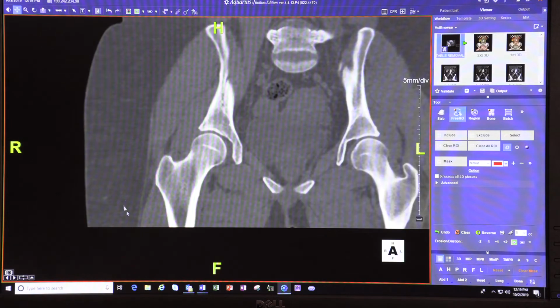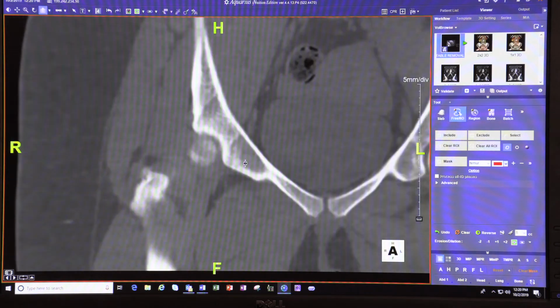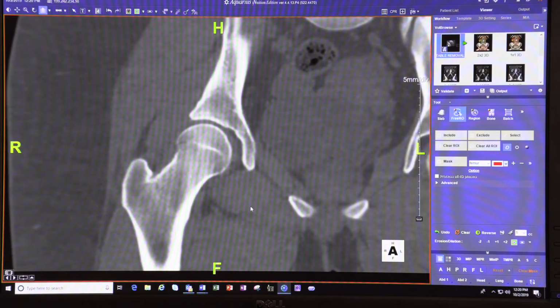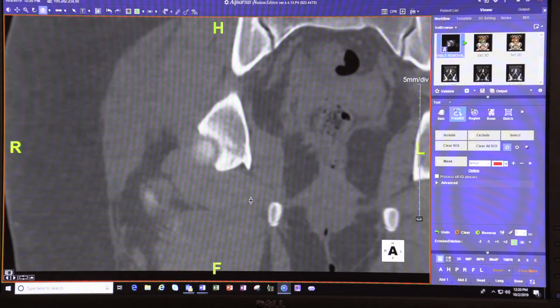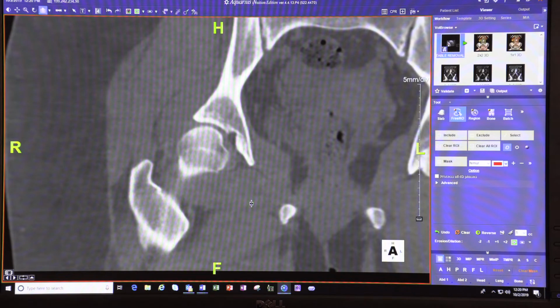So I'm going to magnify that so you can see it. Now you can do a center edge angle anterior, which will be here, right where the obturator internus externus is. You can do it in the middle. You can do it posterior. And when you do it on the x-rays, it's usually superimposition of all the bones.